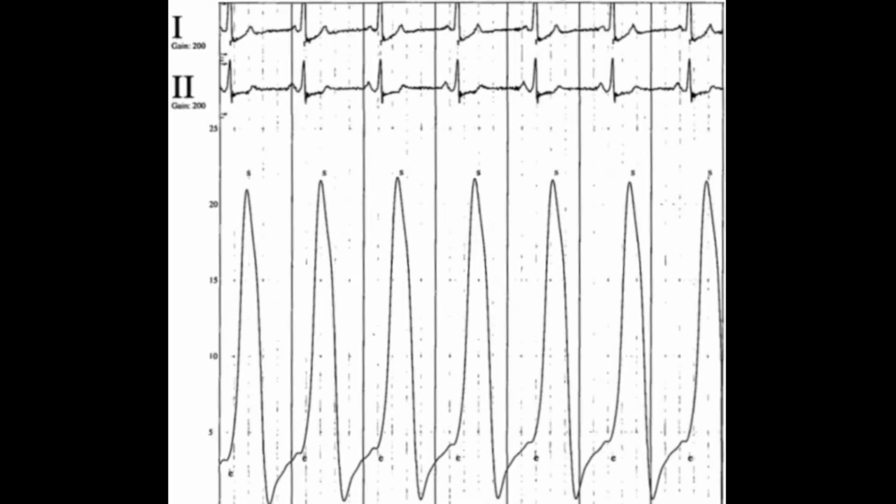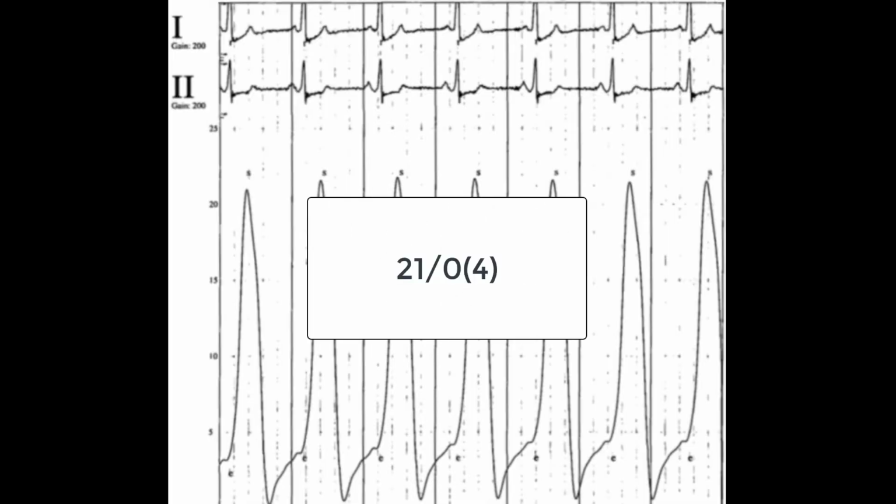In ventricular tracings, the third number that appears in the printout is in parentheses and represents the EDP, end diastolic pressure. In all other pressure tracings, the value in parentheses represents the mean pressure.